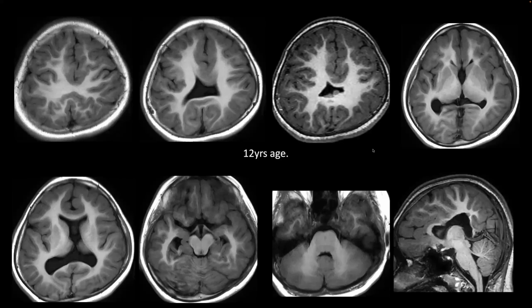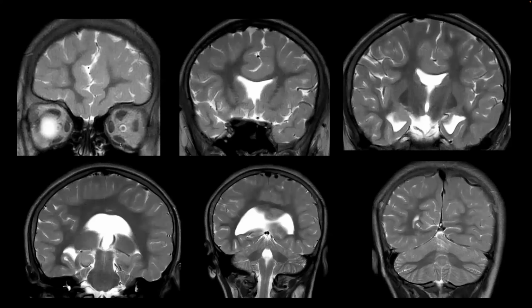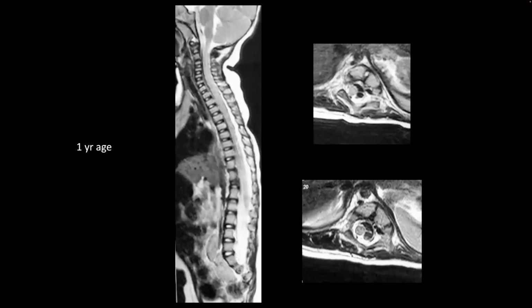So it's a midline or ventral induction related malformation. On the coronal sequences, on the lower sequences, you can appreciate the appearance of the lateral ventricles and the absence of the septum pellucidum, giving this box-shaped appearance. The olfactory system was normal, so the grooves and the nuclei were normal in shape. Again, the ventricles are dysplastic, and the temporal horns are slightly abnormal in morphology. In the posterior fossa, I could not appreciate any abnormalities, at least on these coronal sequences.